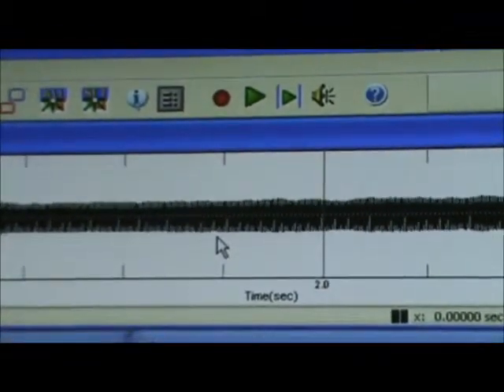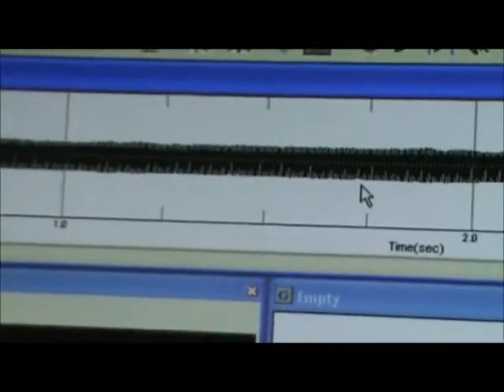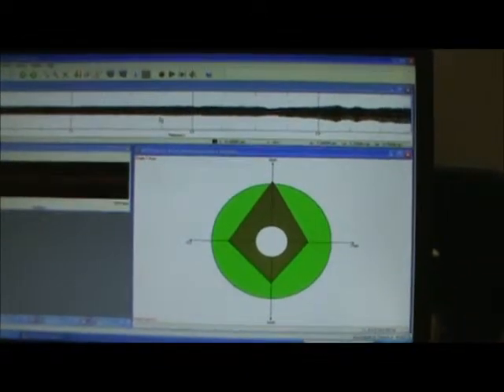But let's just go ahead, and what's different about this one is you don't use that analysis button. What you do is you hit F7, and it's going to play the sample and analyze it. Let me scan out and you'll see what you end up with. So I'm hitting F7. Okay. Oh, and see, it didn't affect my shimmer much, but it did affect my RAP.